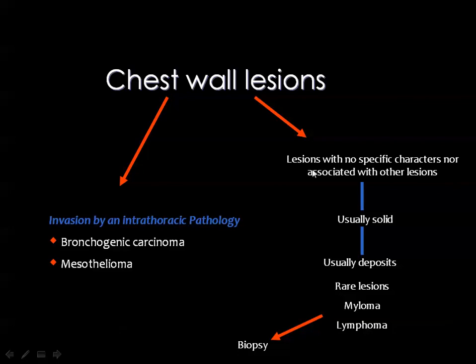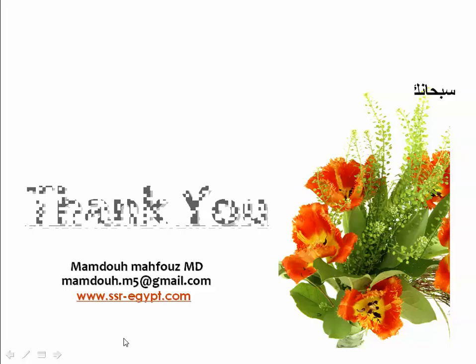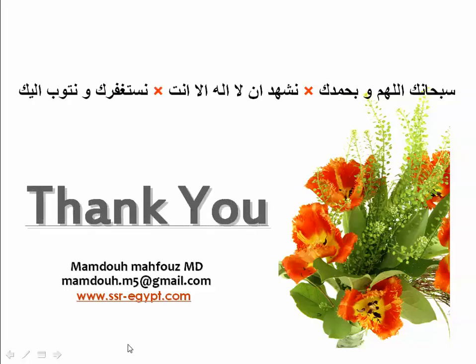If you have a lesion or lesions with no specific characters nor associated with other lesions, and these lesions are usually solid, not cystic, then you consider the possibility of deposits. And other possibilities that may be included, like myeloma and lymphoma, and in most of these cases you will reach the diagnosis after biopsy.